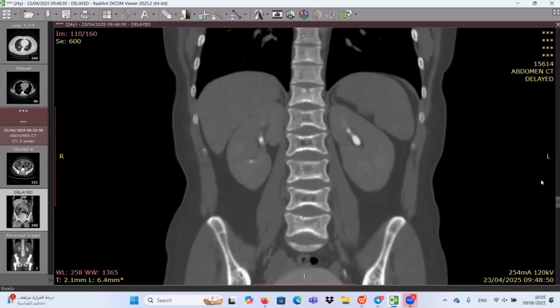You are doing well, very well. But help me, I need help. I think the left pole is enlarged, the left kidney lower pole. Can you ignore the kidneys just for a while? Concentrate on the calyceal. Concentrate on the other findings. Other than the kidney? A part of both kidneys, in this view.